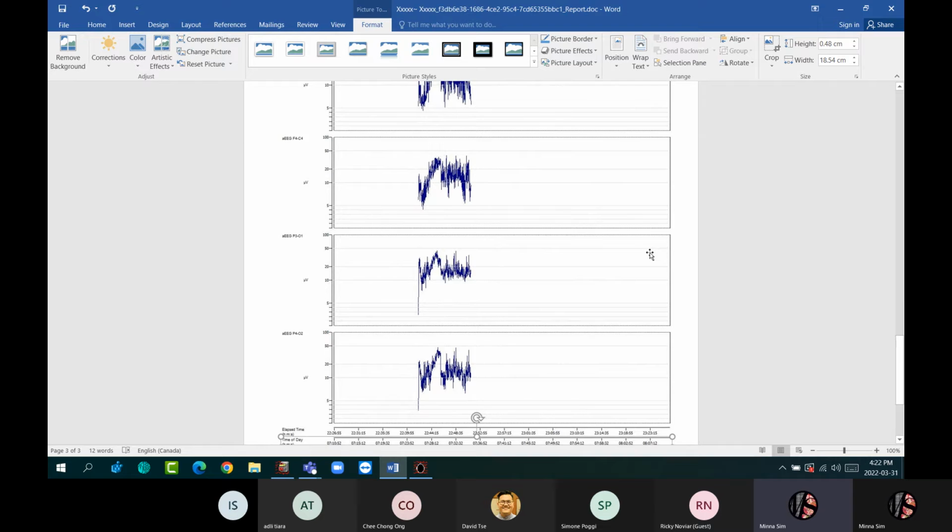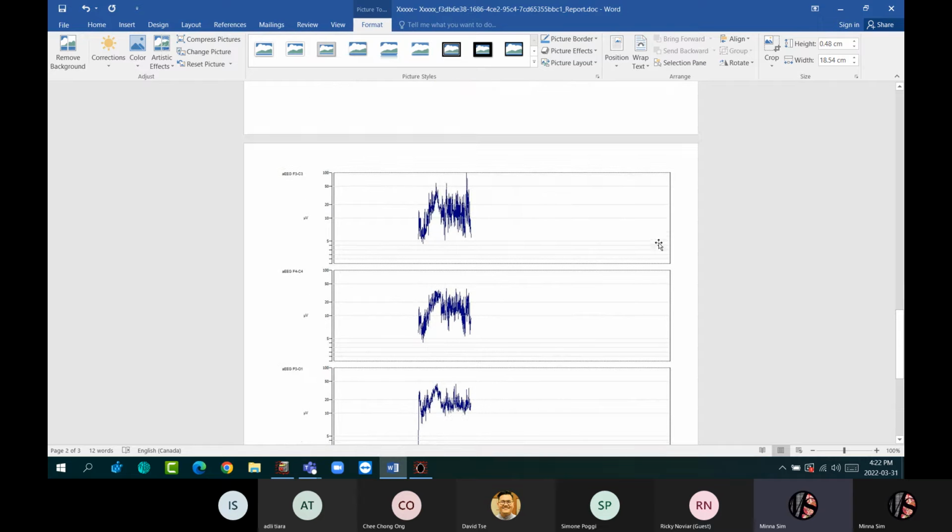So these are the few ways you can do the reporting with the trend summary.